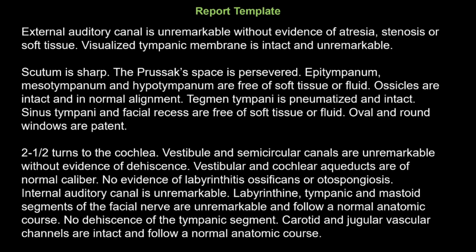So one of the strategies that I did, and I think many people do, was find a template that you like, or the template that everyone uses, and just go down the template and look for the structures that are mentioned in it. Now, this is one of the templates that I find in our system.